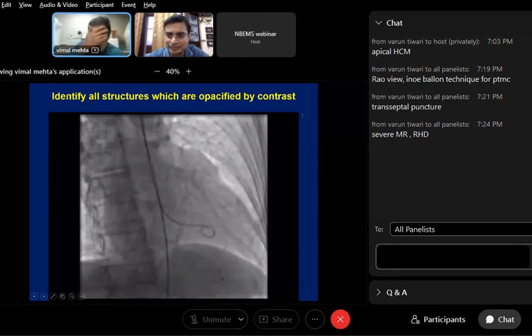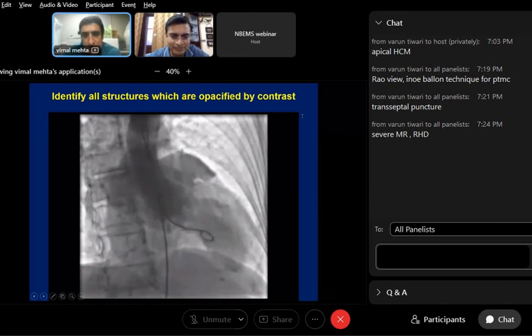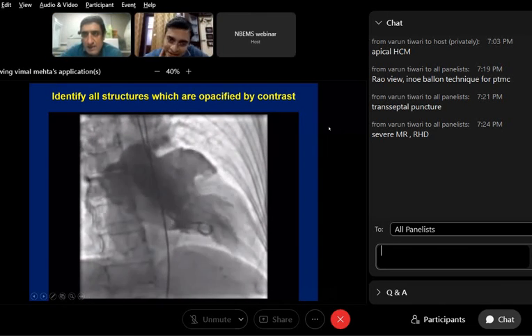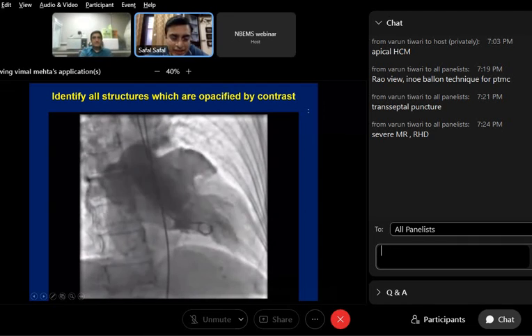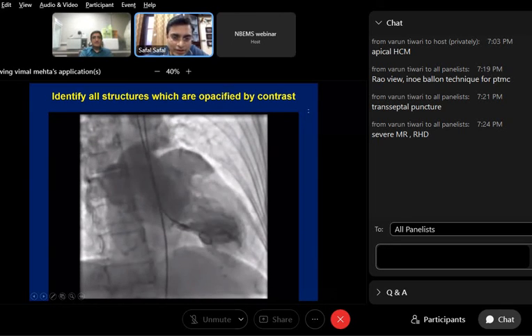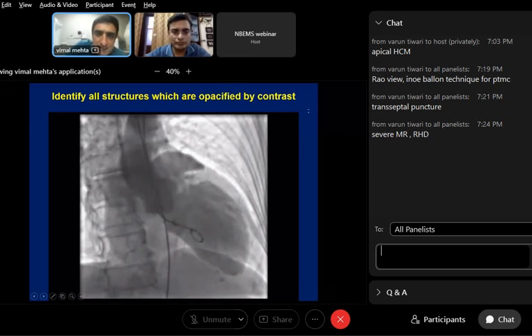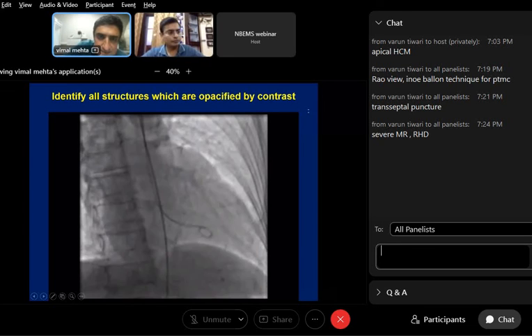You have a beautiful heart. I mean, very good contractility. Why RHD? Why, quickly? Guesswork? Just for the candidate who said truncus, if you would come through the truncus, you would have to be filling both the RV and the LV, or that single ventricle which would fill everything. So that's absolutely a wild answer. So where is the right pulmonary artery? It is not getting filled. So truncus basically means that you have a valve which is a common valve for both the ventricles.